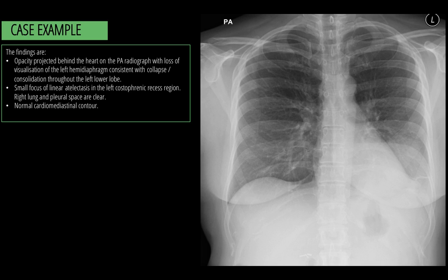Secondly, in terms of assessing the lungs, the best way, rather than starting from medial and working your way out, is to consider doing a zigzag pattern from the upper left and then scrolling across to the upper right and so forth until you reach the lower right or left borders.